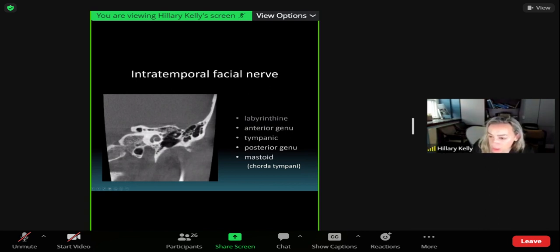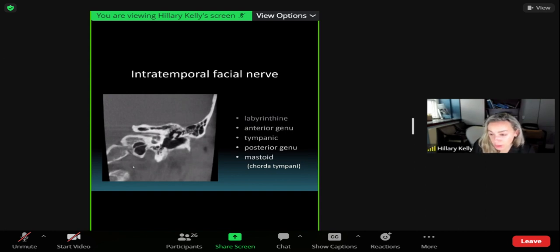So within the cochlea, as I mentioned earlier, you have two big spaces, the scala vestibuli and the scala tympani. And the way I remember which one is which is tympani means it's like a drum, right? And so it's flat on the top and it's the bottom. So this is shaped like a tympani drum. That's the scala tympani. And then the scala vestibuli is the top part, okay?